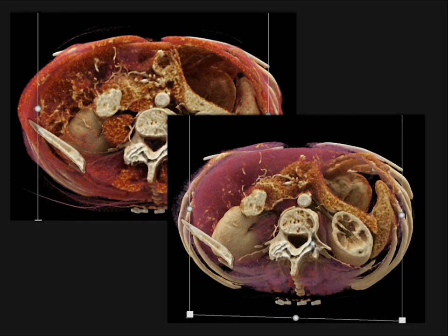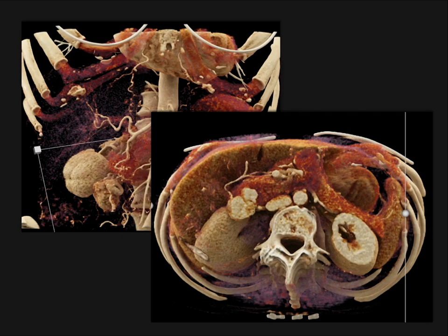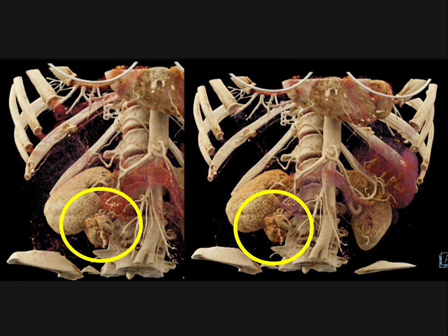And here's just a good example of the cinematic on that patient, really nicely showing you the cross-section of the duodenum and the exophytic nature of the tumor with still an endoluminal component. And here's just another example of showing you that lesion, but also showing you the patient had evidence of metastasis in the liver. But again, look at this beautiful example here, right? There it is, really nicely shown. There's the mass, right lower quadrant. And again, really well shown. So again, think about that as a typical issue.